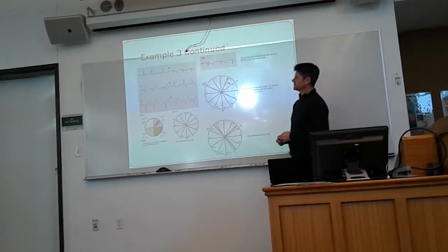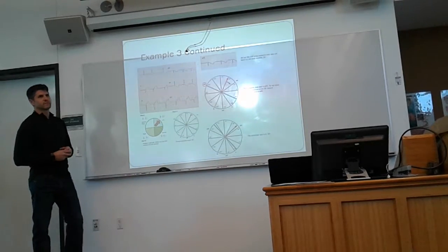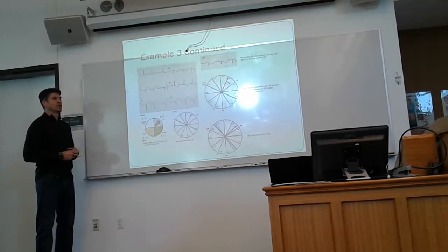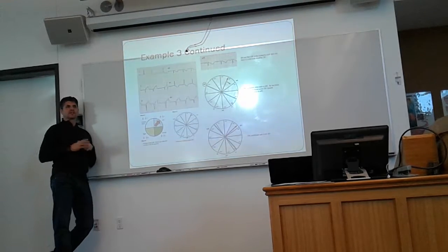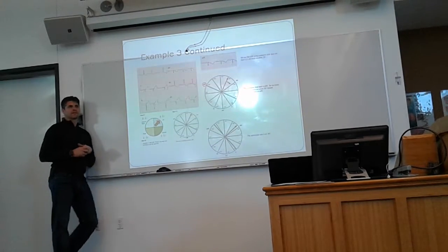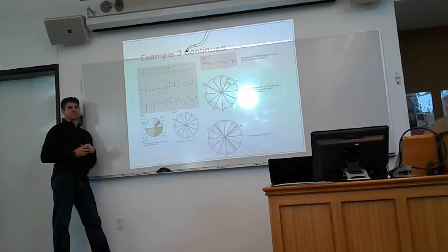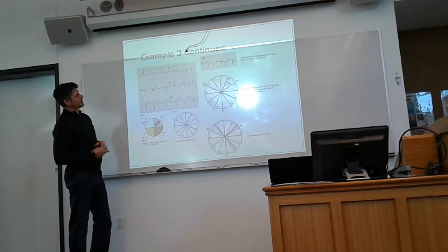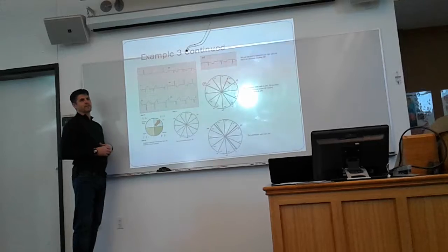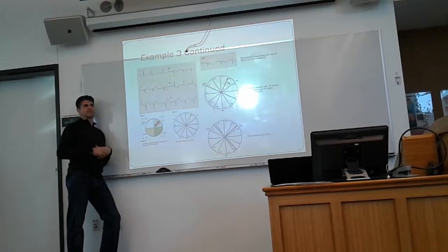We looked at this example. Do we label anything, so right axis deviation of 130 degrees and it's pathologic? You don't have to say pathologic because the fact that it's a right axis deviation is pathologic. Unlike the left axis, which you have to determine, you have to note the difference. But if you just put left axis deviation at negative 20 degrees, you'd be fine. Normally we would say physiologic left axis deviation at negative 20 degrees would be the whole sentence.